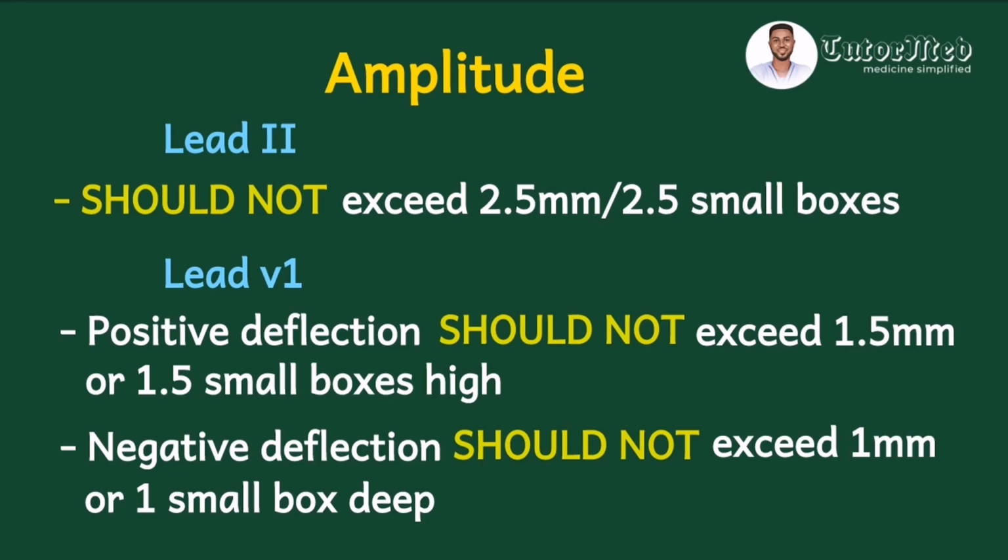And so generally, I want to say that a high amplitude represents right atrial enlargement, especially in lead 2. So kindly keep this general principle in mind.